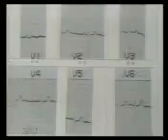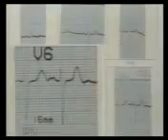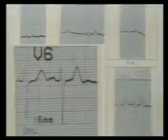The next ECG shows a prominent R wave in V1 and a deep S wave in V6. So right ventricular hypertrophy is suspected. Let us measure the amplitudes of RV1 and SV6. RV1 is 6 millimeters. SV6 is 16 millimeters. RV1 plus SV6 is 22 millimeters. So the criteria for diagnosis of right ventricular hypertrophy are met.